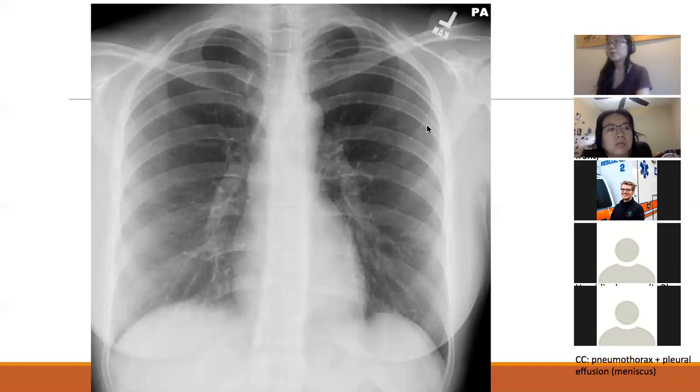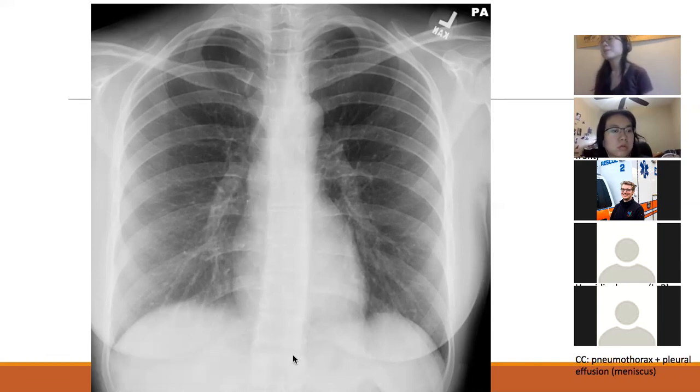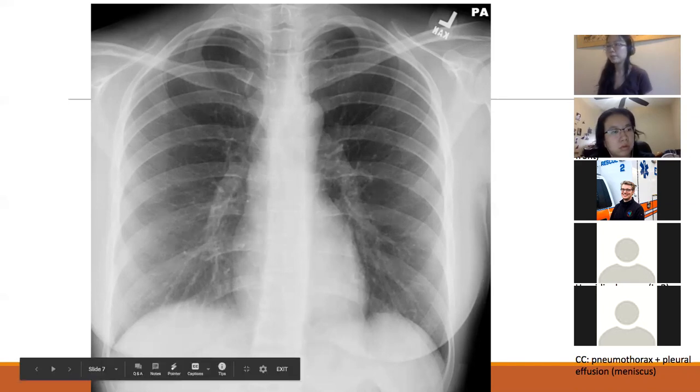So now that we've covered bones, let's jump to organs. So the easiest organ to see probably on the scan is this right here. It's right in the center of your chest. And that's going to be your heart. So we can sort of, as Jenny did a great job of describing earlier, we have the aorta that comes off the heart, and you can sort of see that it loops down, right? And then it continues downwards like this. And this right here is going to be that aortic bump, right? And then we can follow the descending aorta all the way down, and then, you know, further down it'll bifurcate and form some of the lower extremity arteries.